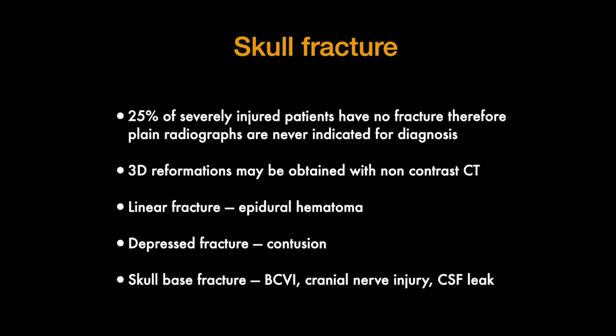Skull fractures are something we want to know about, and if we have a 3D reformation available, that can make them much easier to see than on axial CT images. So we generally will do 3D reformations whenever we see a skull fracture or suspect a skull fracture. Linear skull fractures can be associated with epidural hematomas because they can traverse the branches of the middle meningeal artery. Depressed skull fractures can be associated with contusions. Skull-base fractures, as I mentioned before, are associated with blunt cerebrovascular injury, but also with cranial nerve injury and later CSF leaks.